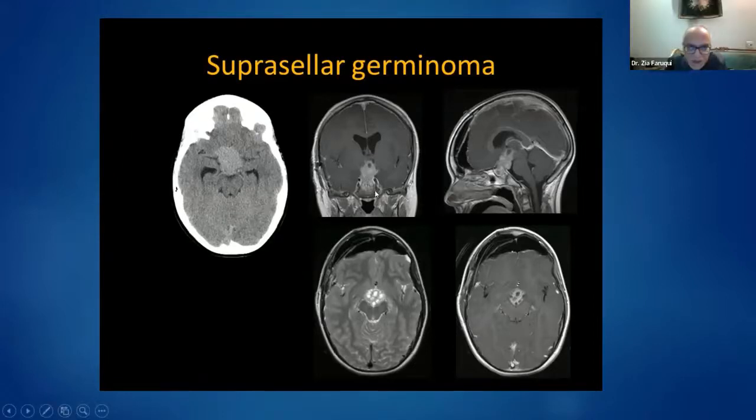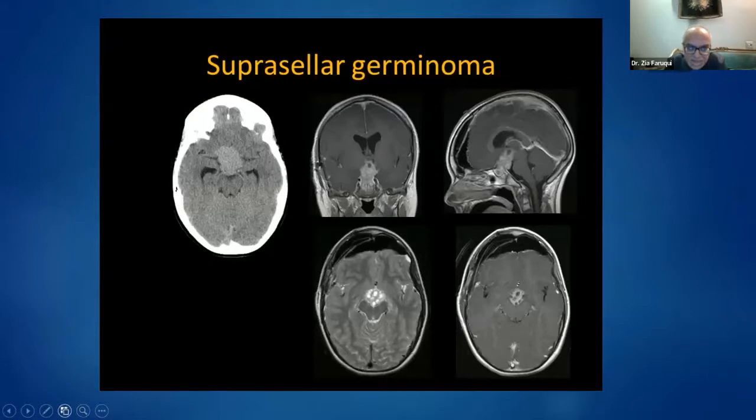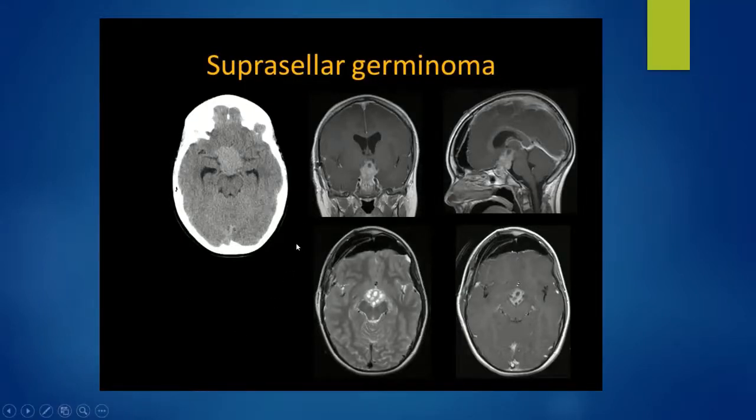I've told you the pathology, it's a germinoma, suprasellar irregular enhancement, and what else is there to look for? Aisha? Okay. So it's a homogeneous enhancing area in the suprasellar location. Yes, we've said that, what else? It's a pneumocranium. So it seems to be abutting the brainstem posteriorly. Yes, agreed, it's gripping the suprachiasmatic region, going up to the third ventricle, and what else? What else do you need to tell your surgeon or oncologist or clinician? Our neurosurgeon has said it already. Post-surgical pneumocranium.